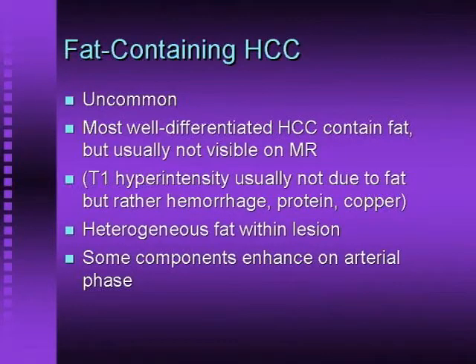These are pretty uncommon, and just because it's bright on the T1 doesn't necessarily mean that it's fat, so the in-phase and out-of-phase acquisitions can help you characterize the fat in the lesion, and the worrisome components are those that enhance on the arterial phase.